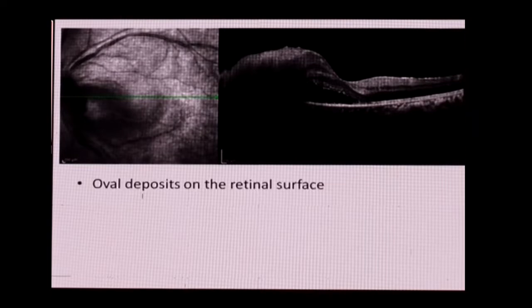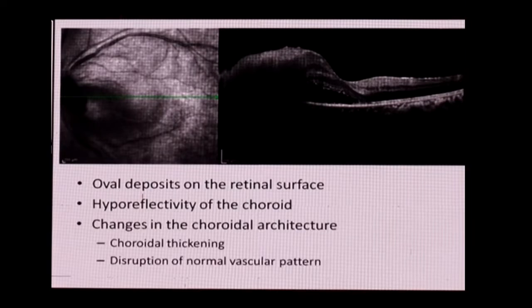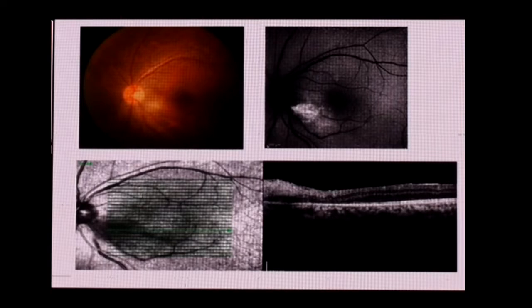When they compared it with the viral retinitis, the toxo group definitely had this, and none of the viral eyes had any of these differences, especially the changes in the choroidal architecture. Now, when we look at the pathology, you have a chorioretinal involvement in patients with toxo, so this probably justifies the changes in the choroidal architecture. Here you could use the infrared to delineate the retinitis better, and here again, the choroidal architecture is starting to come back as the lesions are resolving, and there is resolution of the fluid, but the outer layer looks relatively okay.